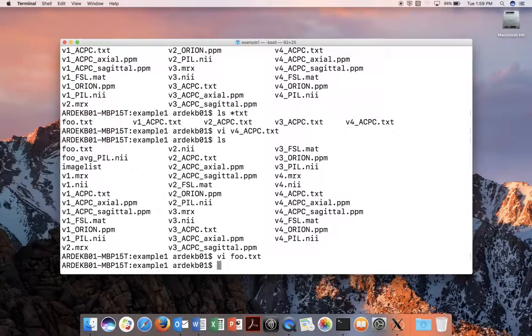Okay, so in the next tutorial, I am going to go over a case where the landmark detection fails, and show you in such cases how to remedy the situation. Landmark detection fails in less than 5% of the cases.